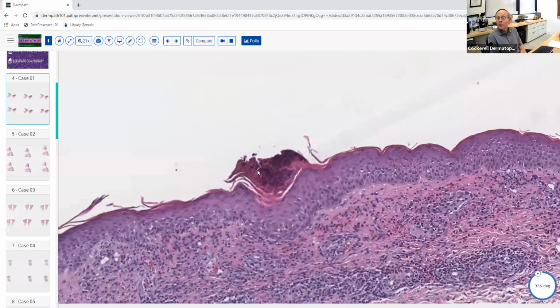And that's actually Dr. Ackerman years ago used to have a little session, a lecture he gave, like a diagnosis to the cornified layer alone, where you can just look at the cornified layer of the epidermis, and you can come up with a sort of forensic files. You can suggest a diagnosis just looking at the type of changes in the cornified layer.